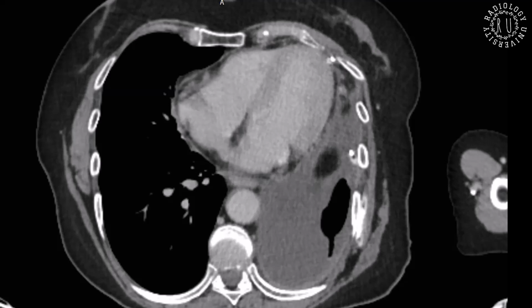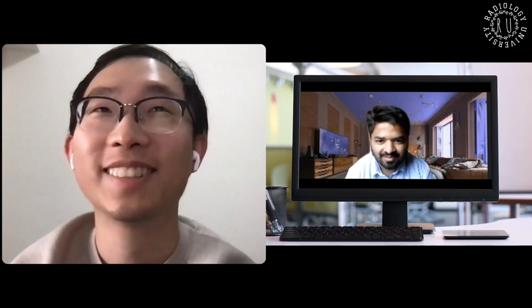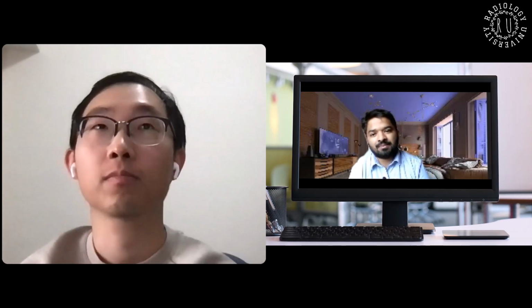Okay. And yes. Sharing. So feedback time. So you did good. When you are given cross section, you are more confident. That's what I felt compared to the radiographs. When you're describing radiographs, once you have found a prominent finding, you need to also describe the negative findings about it. For example, if there is any destruction of the surrounding ribs, whether anything else is going on, whether there is a pleural effusion surrounding.